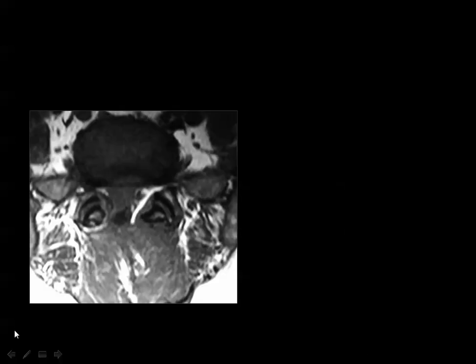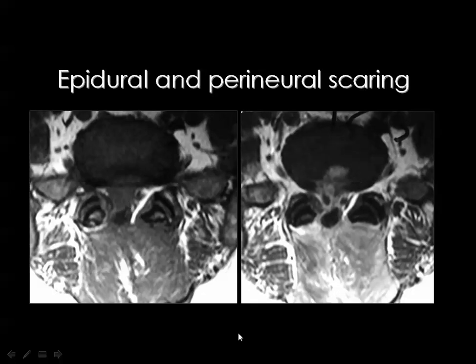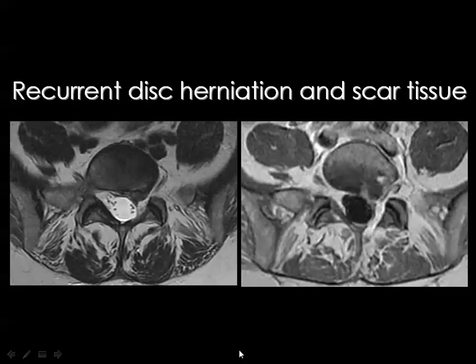In this case, you see this is a spinal laminectomy, and there is a big defect in the posterior aspect of the spinal canal, and this is the thecal sac, and you see a big shadow here. Then you inject contrast medium, and you can see easily that this shadow represents a postoperative scar, and there are two nerve roots, and this is the thecal sac, which is decompressed at the laminectomy defect.